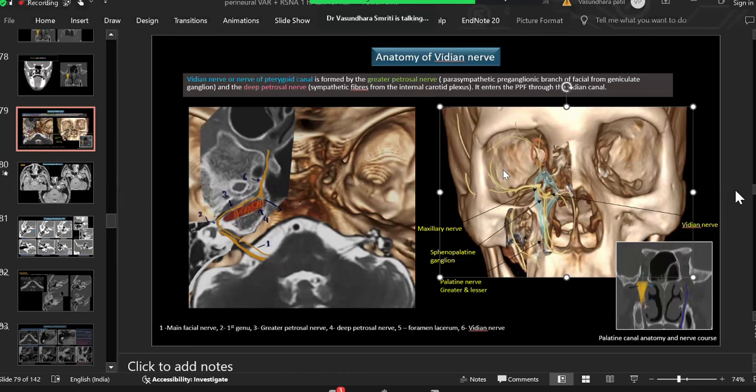RT versus perineural spread. Difficult to see, but if we start getting a soft tissue, we know that there is a relapse. In CECT, we report a lot of buccal mucosa cases. Most of the time, if we are sure, we don't ask for an MRI, but the eyes are trained for it.